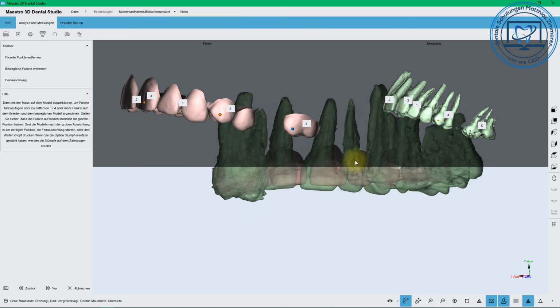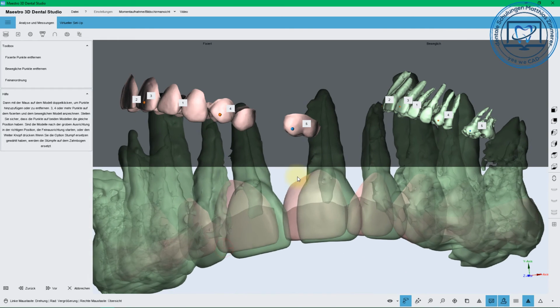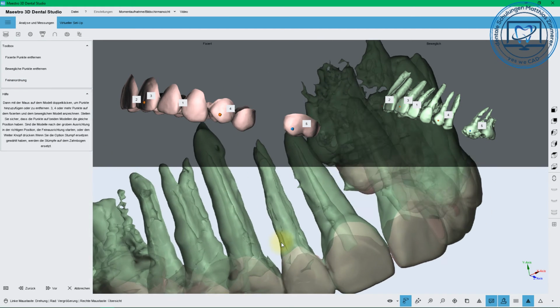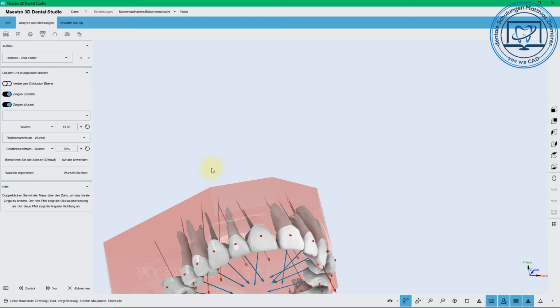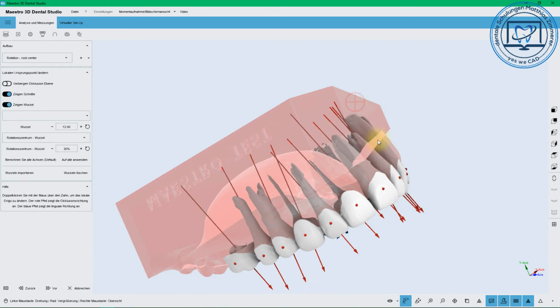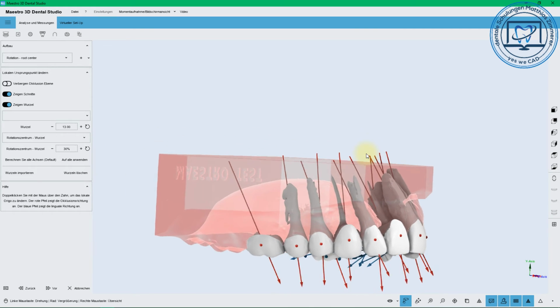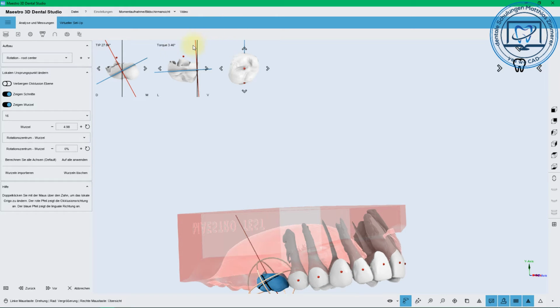The software automatically positions it, you just put the points on the teeth, and you can remove them, and in the fine adjusting you will get the roots adjusted to the teeth. The software is calculating, and then you have the optimized result, and like seen on the 6, there is nothing. And if there are some teeth with root fillings, it's also a little bit tricky.